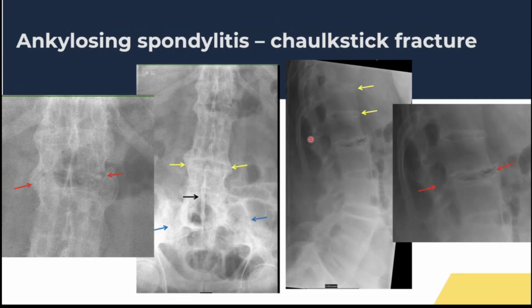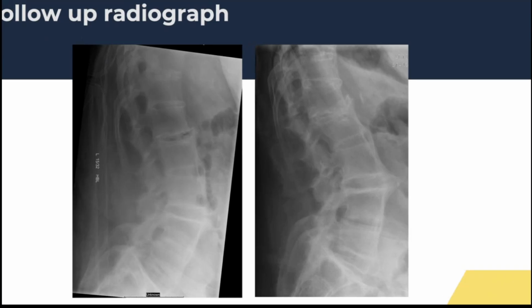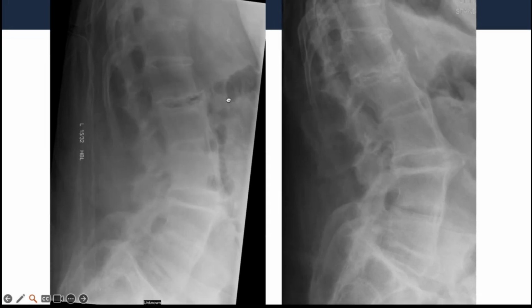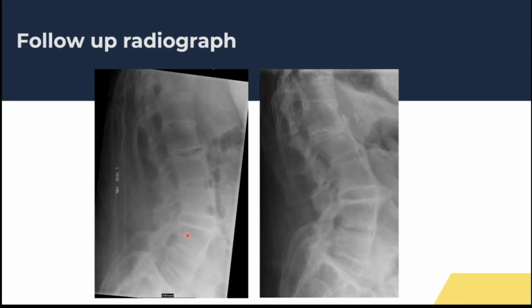If we go to the next slide. So yeah, you can see, unfortunately, we had a follow-up X-ray, and you can see the fracture's progressing, and now at that same level, there is some narrowing of that space further. And if we go to the next slide.